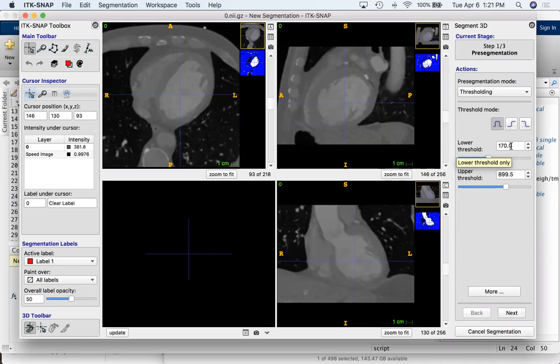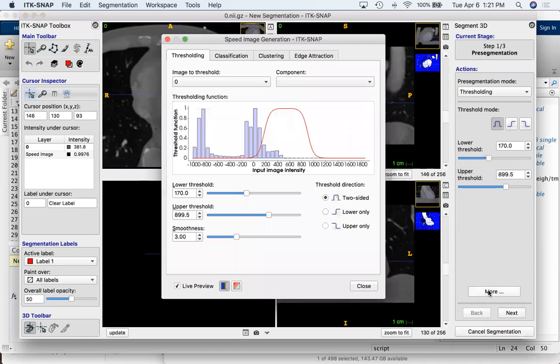Of course, yeah. If you send me the .m, I will use that. And then I set it to this. I do lower threshold only. Smoothness is 10. Can you wait 1 second?